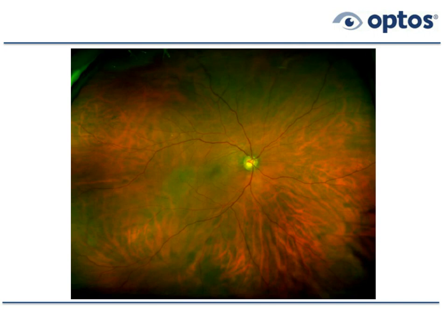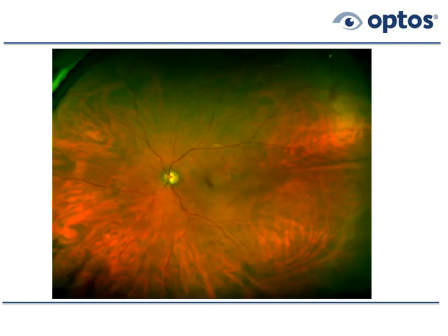But in addition, the disc looks a little bit unusual, and the disc is actually pale. This patient has two disorders. It turns out having glaucoma and also having central serous. But let's talk about the central serous. Here's the left eye of the same patient. I think you can see the vertical cupping. You don't really see much going on at the level of the retinal pigment epithelium.